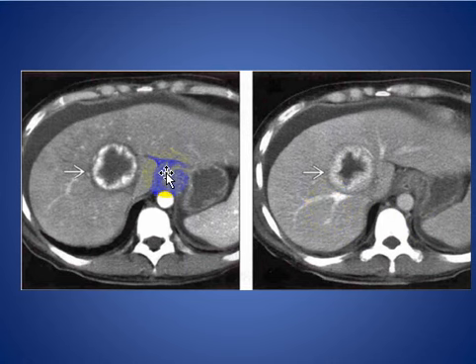Here we see in this patient with peliosis hepatis ring enhancement in the arterial phase, with more filling in the portovenous phase. It is similar to cavernous hemangioma, but in hemangioma the enhancement is nodular in appearance rather than a complete ring.